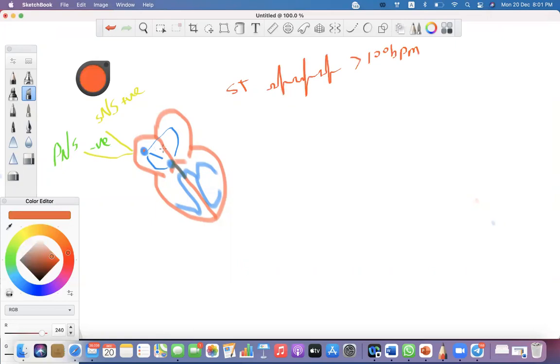The second form of tachycardia that may occur is when the atria develop multiple foci. Instead of the SA node, there will be three or more separate foci acting as pacemakers of the heart. At each cycle, every focus will stimulate the atrium from a different part, producing a certain shape of P wave.